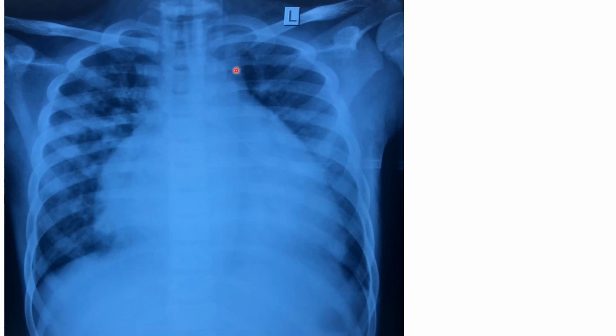These are old water bottles, olden era, some 100 BC or 200 BC water bottles, where you have a straight mouth, something like that, and then you have a water bottle, right? So it's a water bottle sign, or the money bag sign. So the money bag that olden people usually carry, it should be something like this, and then here they can hold it.